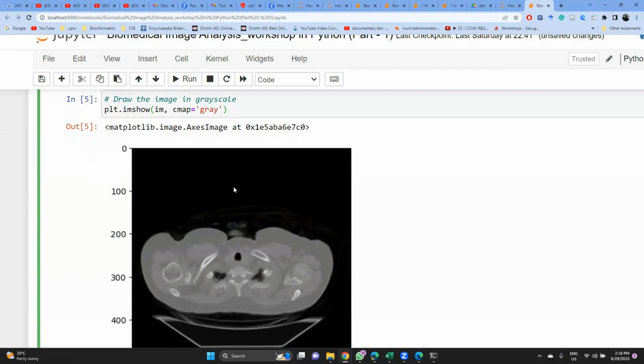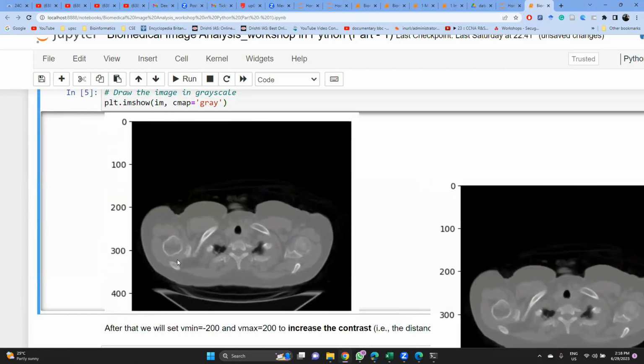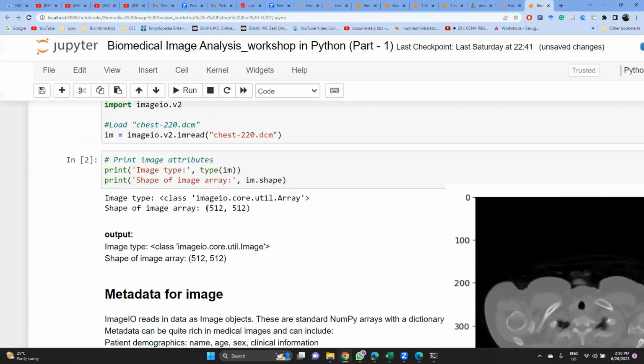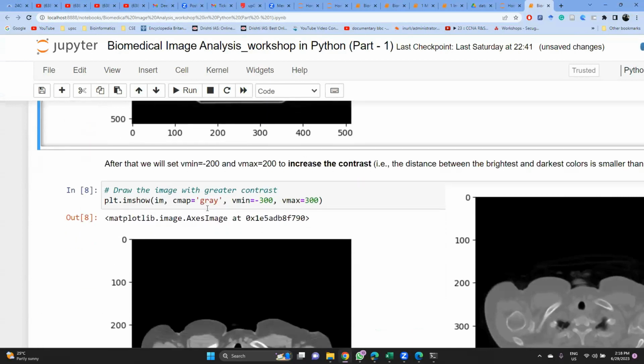If we have to look for enhancement, or look for much more information related to the particular image, then we have to convert it into grayscale, or black and white image. We have to change the intensity of that particular image so that we can get much more information. Over here we can see that this image contains these tissues and other information. But when we look at the bottom, we will see that it contains other data also. So we will segregate how it will look like.